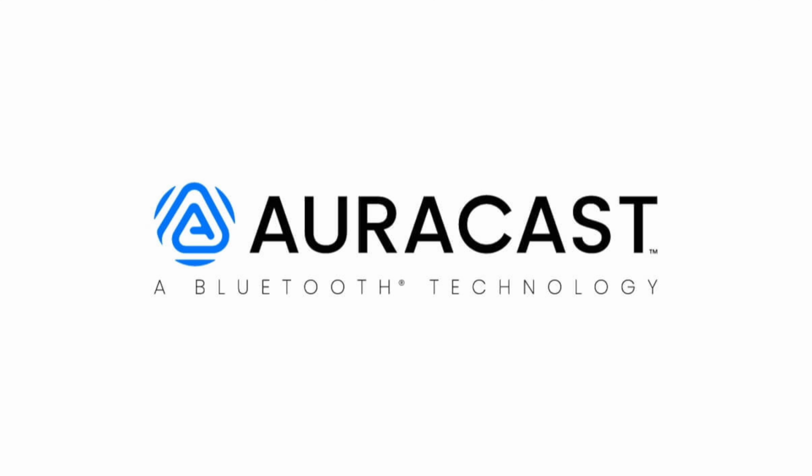All right, now that's everything that you can do with the MyStarkey app and with an Apple device, but I also want to show you something that you cannot do with an Apple device, which is access an Auracast broadcast signal. So even though your Starkey hearing aids have the ability to tap into an Auracast signal, Apple devices do not give you that ability for third-party devices. Yes, you can still use Apple devices to access the Auracast broadcast signal from the Starkey TV streamer that you directly connect these up with, but if you want to connect up with anybody else's third-party streaming device that uses Auracast, you have to use an Android device. So let me go ahead and show you how to do that real quick.